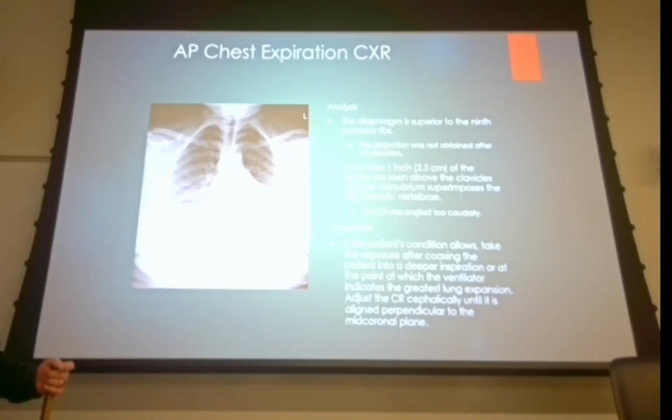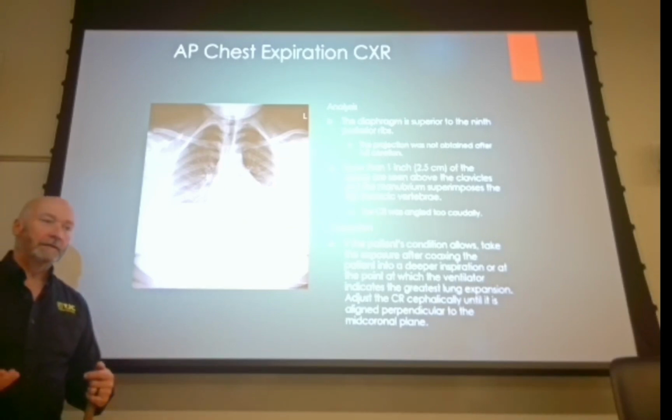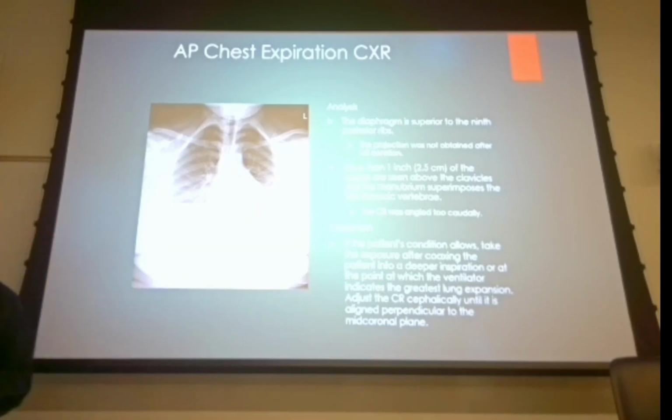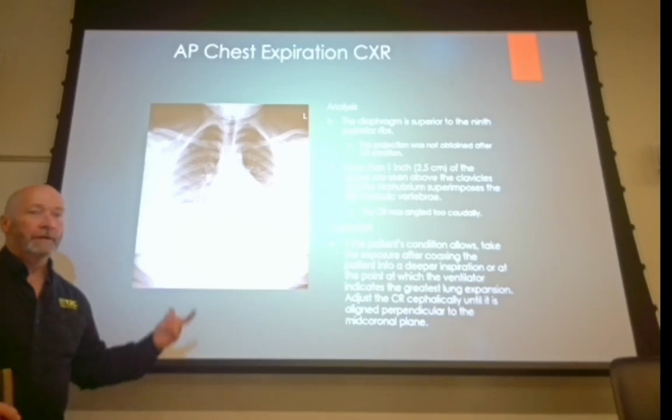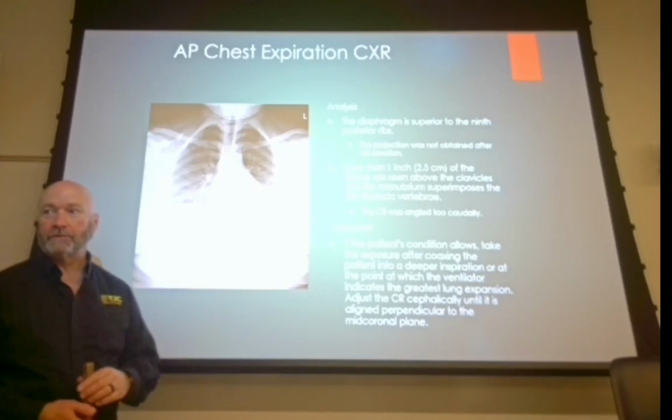The other thing is if the patient has a foreign body. So the patient was eating a hot dog and somebody told a funny joke and they inhaled and choked and it went down which main stem? Right main stem bronchus, right. So what we might do is an inspiration and expiration chest x-ray to see if that lung is getting any air to it at all.